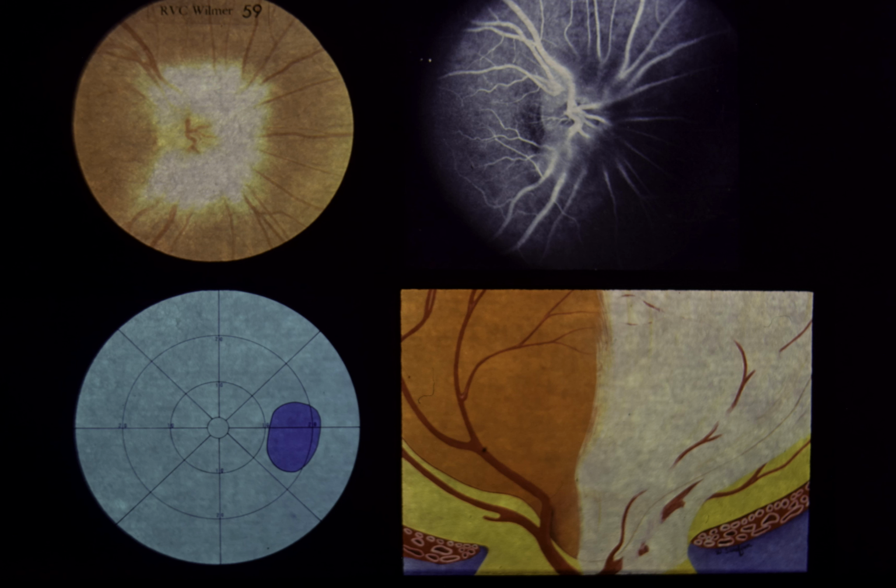Myelinated nerve fibers follow the pattern of normal nerve fibers and extend peripherally as irregular, feather-shaped patches. The retinal vessels may or may not be obscured by patches of myelination. Most patients with myelinated retinal nerve fibers have normal visual acuity.